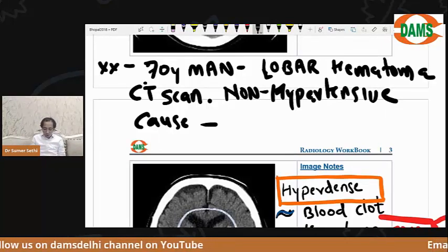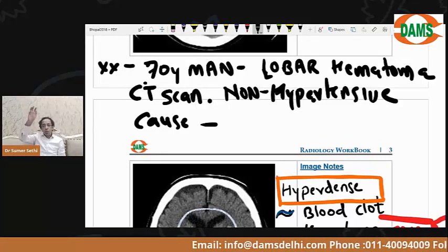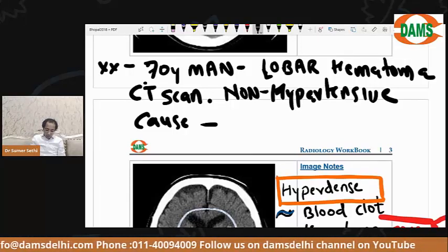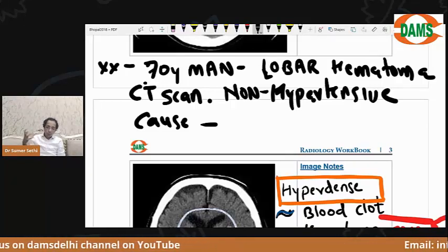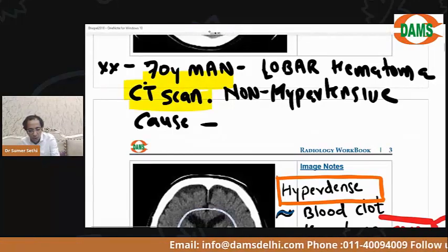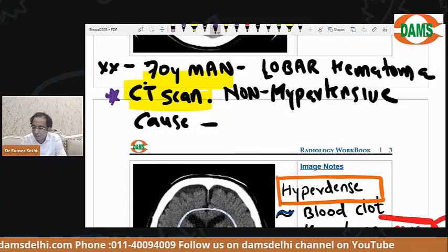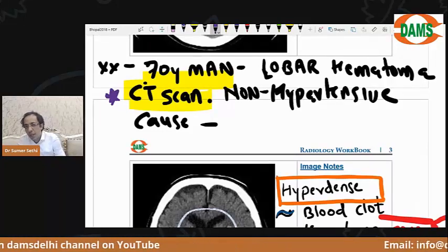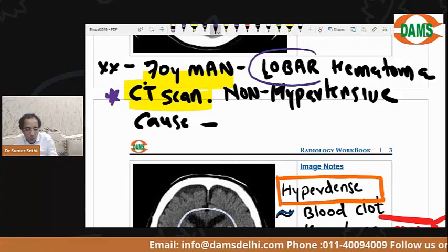Let's see if you can answer. But we already know that brain hypertensive bleed is unlikely to be present as a lobar hematoma, है ना? अब वो कह रहे लोबार ब्लीड है. ओके, वो कह रहे लोबार हेमेटोमा, लोब में, फ्रंटल लोब में, टेम्पोरल लोब में ब्लीड है. 70-year-old आदमी है, क्या कारण होगा? Anybody can tell me this answer and then you can take a seat, है ना बच्चे? देखो सोच के बताना है. हाँ, anybody? Now, some of you are saying aneurysm. But it's not aneurysm. Aneurysm will cause subarachnoid bleed, जो मैं बाद में सिखाऊंगा. ये parenchymal bleed है बेटा, ये subarachnoid नहीं है, ये brain parenchyma में लोब में hemorrhage है.